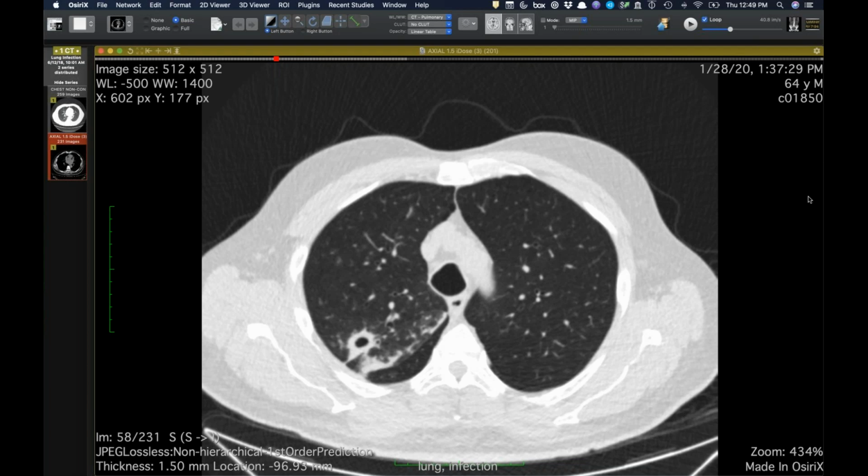But you see that with any kind of inhalational disease, even larger particles. Like you said, early silica and coal, even some very mild cases of sarcoid, and you see the earliest emphysema. If you see very mild centrilobular emphysema, there's clearly a right dominance. So maybe it's multifactorial, but I think lymphatic drainage plays a lot into that, because that's been consistent across multiple lung cancer registries and studies where you get a significant number more right upper lobe cancers than left.